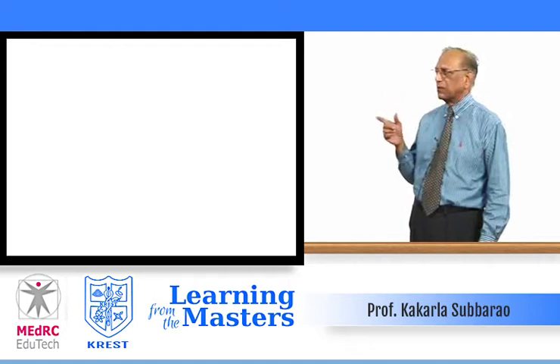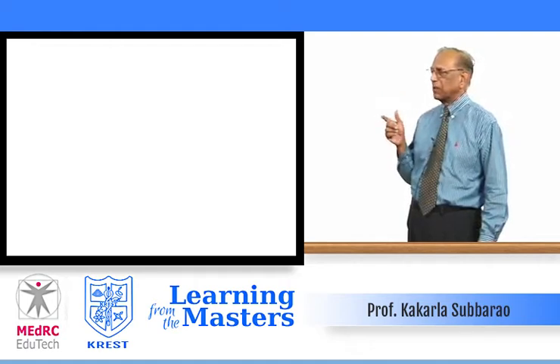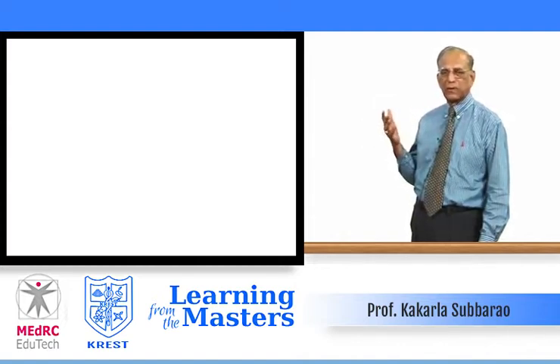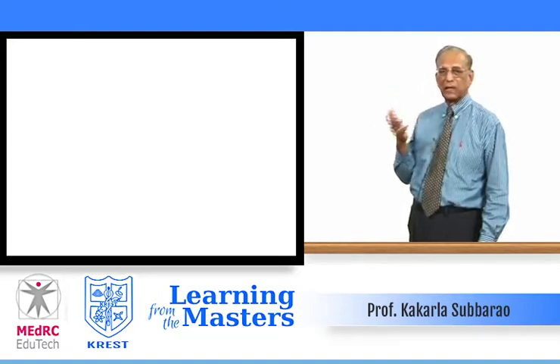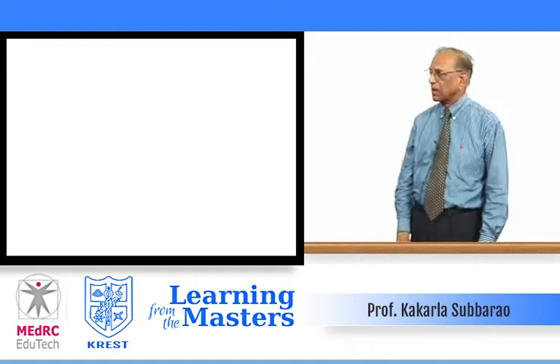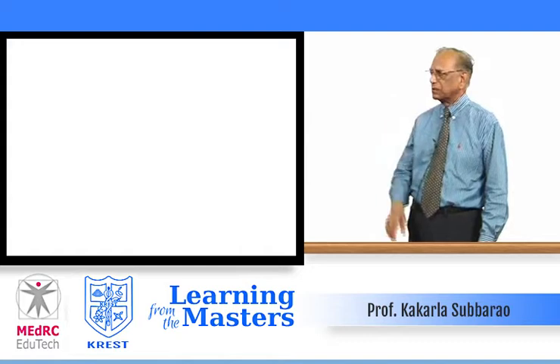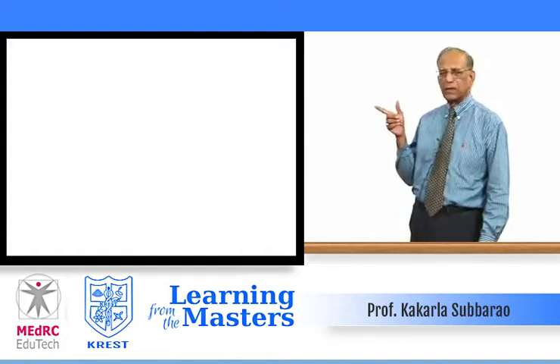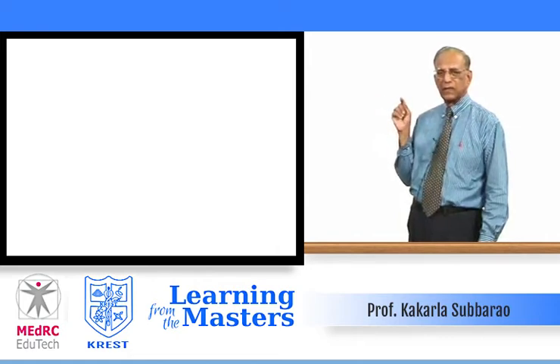Again, another loculated effusion with calcification, chronic empyema. CT only showed that calcification. CT is better than PA and lateral views of the chest because it shows the calcification which may not be seen on conventional radiographs. Another loculation in the right lower zone. And in the CT, again, I emphasize, CT is essential to demonstrate the small cavity and also calcification.